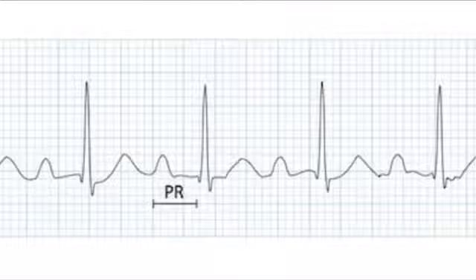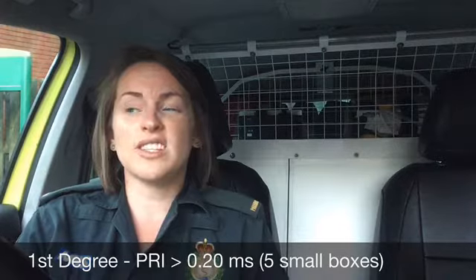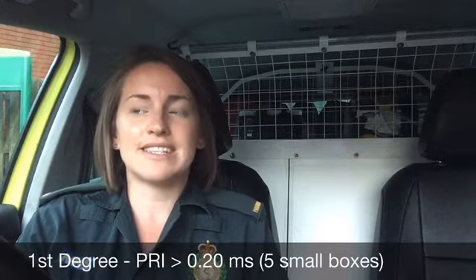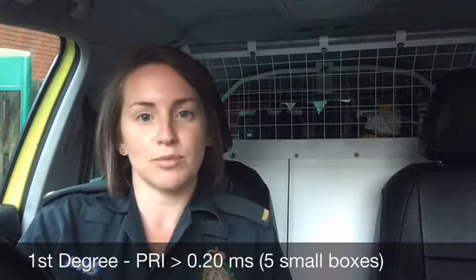You've got your ECG and you see in the little number at the top that there's a PR interval over 0.20. The next step is to print a really, really long rhythm strip. This long rhythm strip will help you to mark out the P and QRS correlation, because identifying these blocks is about how correlated they are. So you print off your long rhythm strip and you see a constant distance between the P and the QRS, over 0.20. This is simply a first degree block. There's just distance there. This can be quite common, and in the pre-hospital field it's not significant on its own. In isolation it doesn't mean that the patient needs cardiac investigation or hospital. That's quite simple to get your head around.